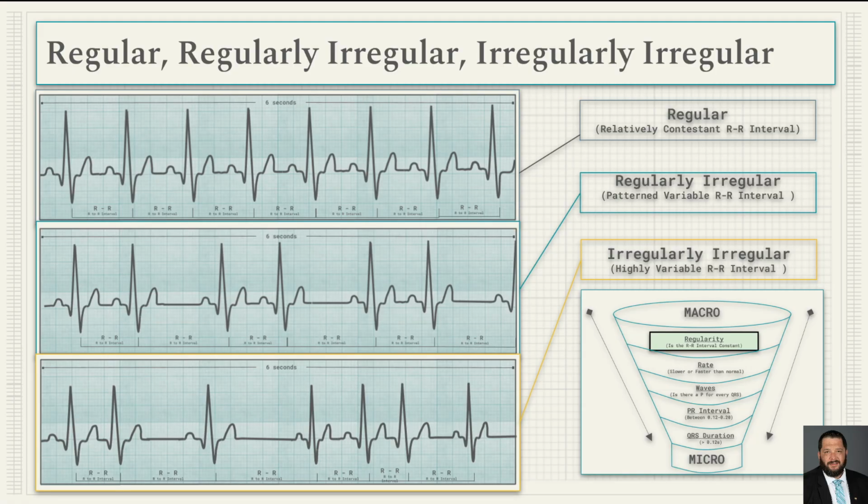But when it's largely consistent, each R wave to the next measures roughly the same, we're going to call this largely regular.